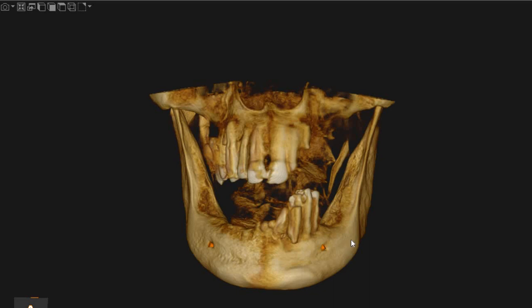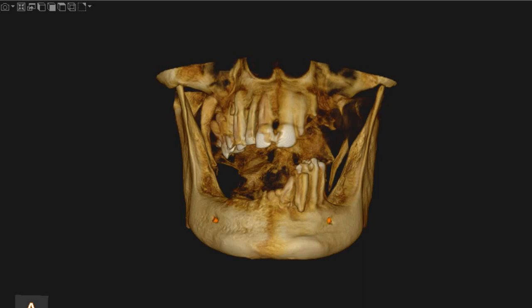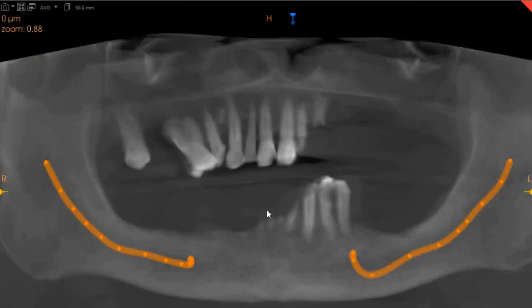Telecom Ultrascan Diagnostics. Here is the CBCT of the patient that you had requested. The area of interest is the lower jaw. On the panoramic view, you can very clearly see that there is an edentulous space in the anterior and the lower right side, and we've got canine, two premolars, and no molars on the lower left side.